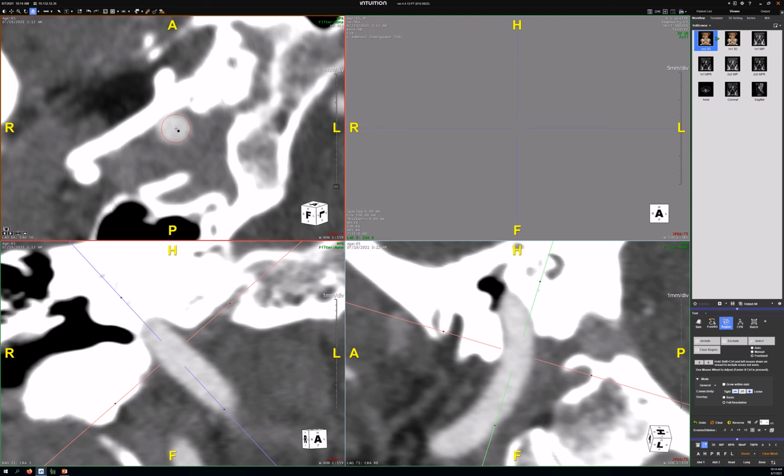There, good. Now just click once. Do I hold it left down? Yeah. Now move it the other way and hold it down until you're at the edge of the long axis that way. And now click. So now when we click on include, it should include voxels there.